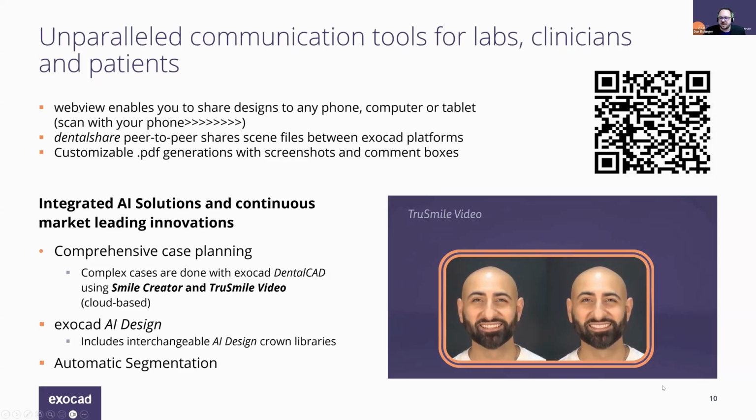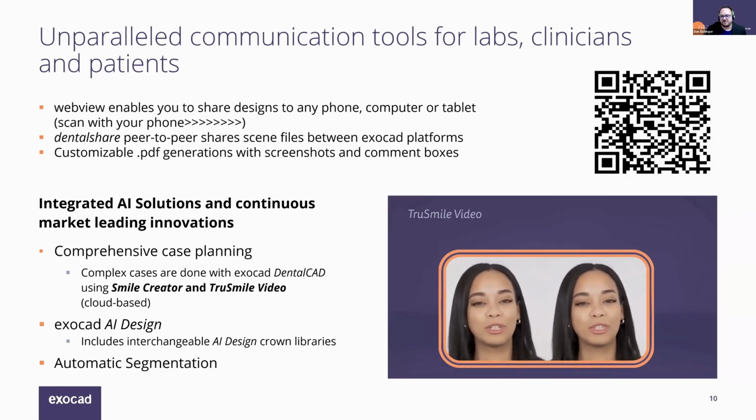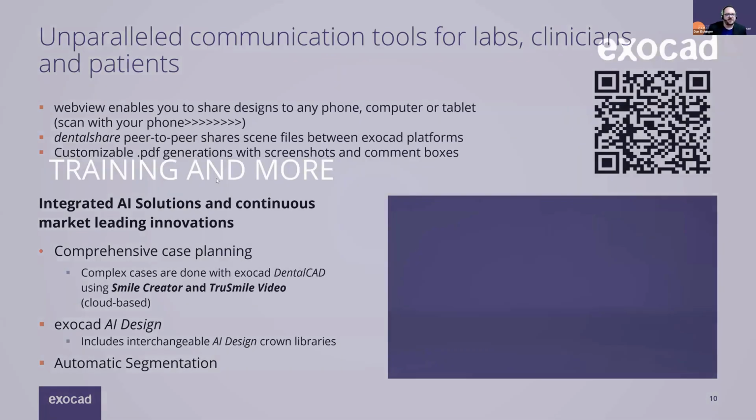So all these are just kind of examples on the right hand side there, but the patient on the left is their existing teeth, and the patient on the right is with their design replacing the teeth. So you can kind of see here, it looks great. But we'll go ahead and proceed forward.